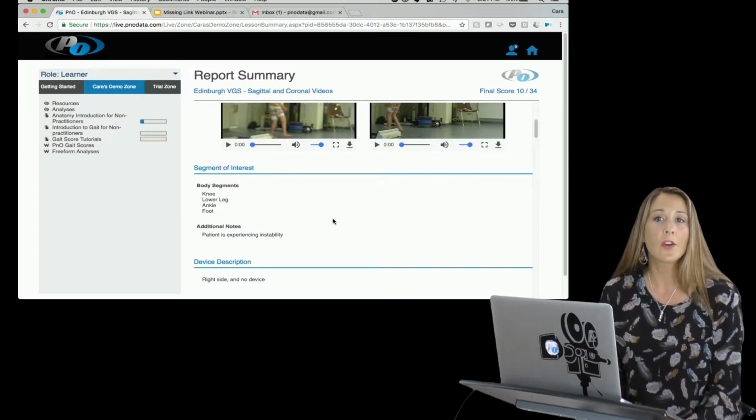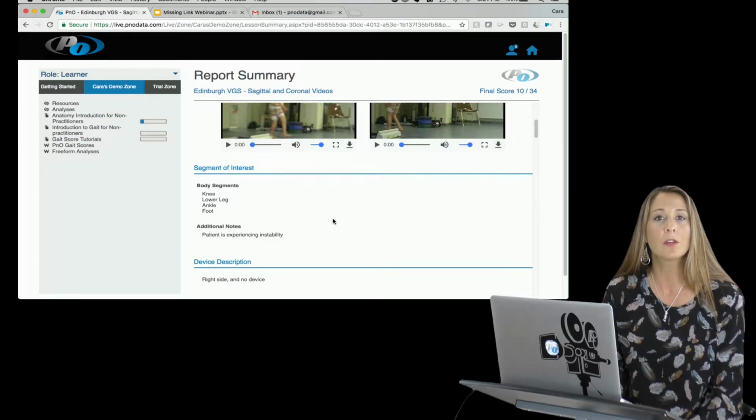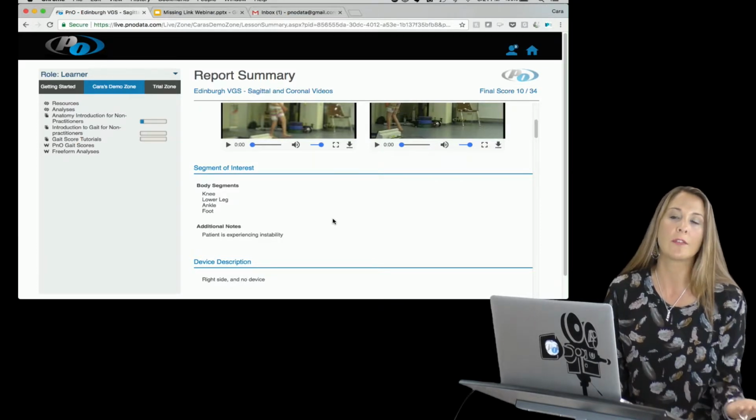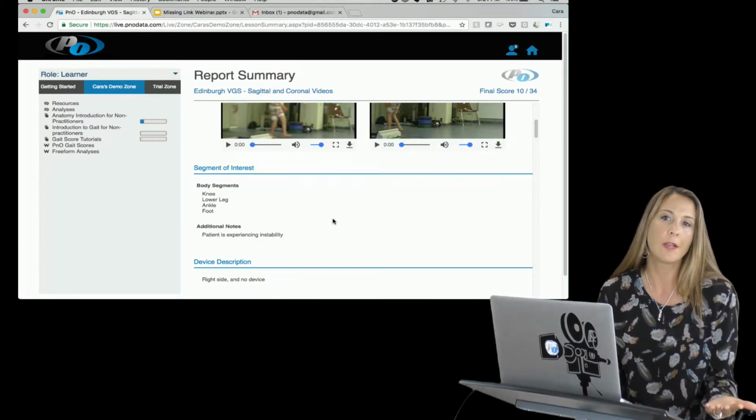So the other part about this was that if you exported this and you attached it to an electronic medical record, it was sometimes more tedious because then you'd have to attach maybe the videos as well, which might bog down your electronic medical record.